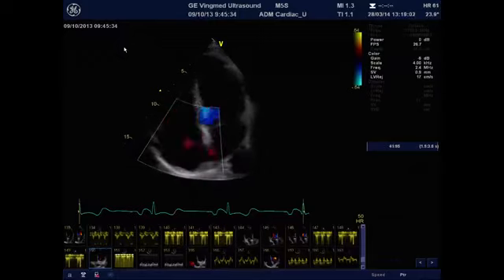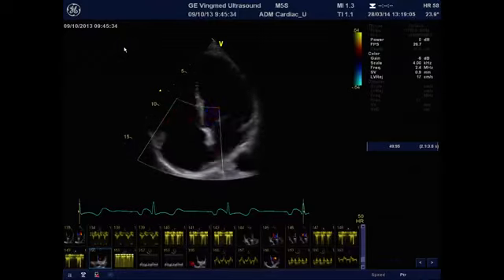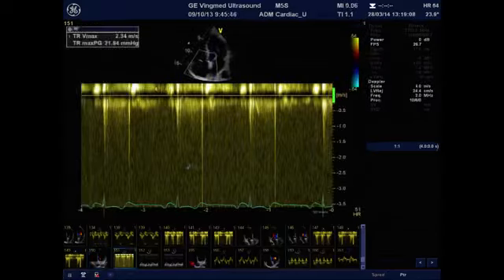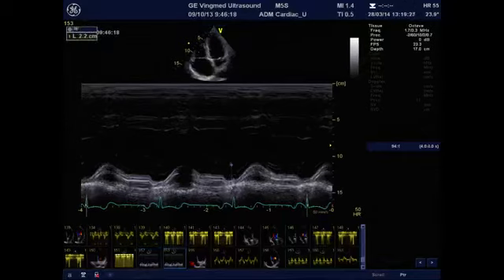You should assess the pulmonary pressure using the transtricuspid gradient. So simply, as you all know, you just take the max velocity of the continuous wave Doppler on the tricuspid regurgitation. You can also quickly assess the right ventricular function using the TAPSE with the M mode.